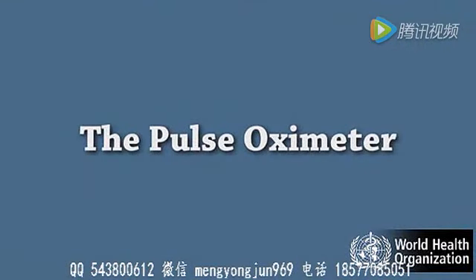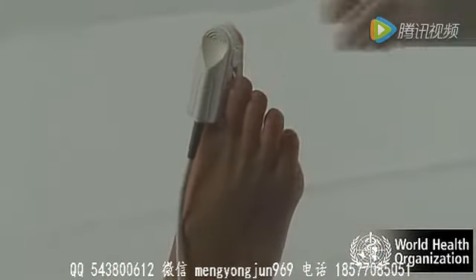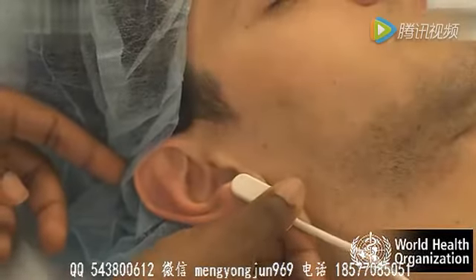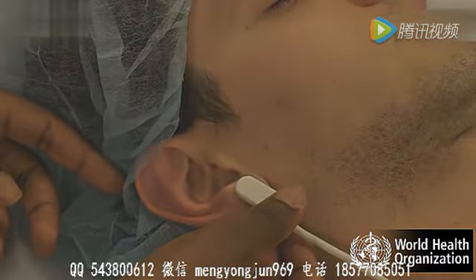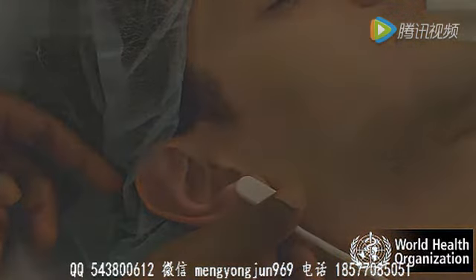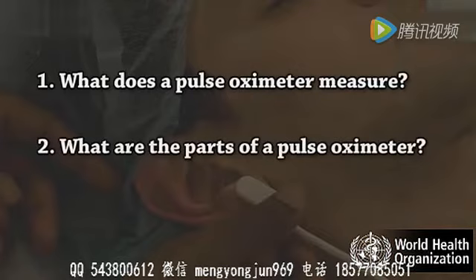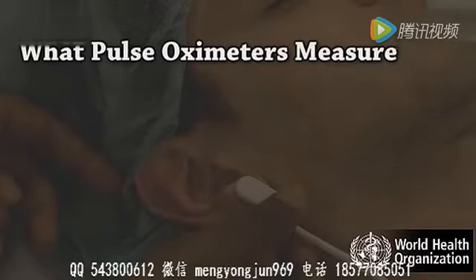The pulse oximeter. There are many different models of pulse oximeters available that may differ in appearance and size. However, the underlying function is the same in all of them. This section will cover 3 key concepts common to all pulse oximeters. 1. What does a pulse oximeter measure? 2. What are the parts of a pulse oximeter? 3. How to use the pulse oximeter. What does a pulse oximeter measure?